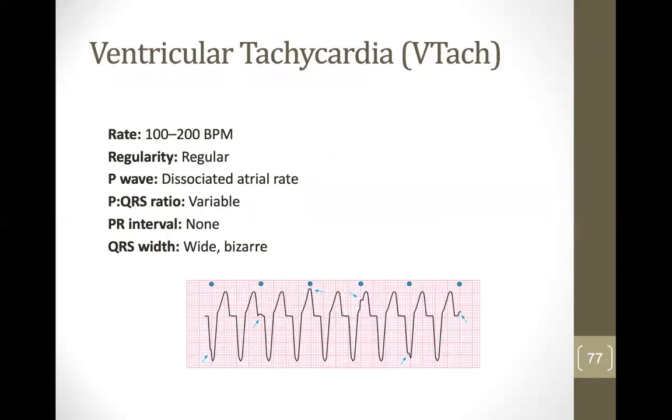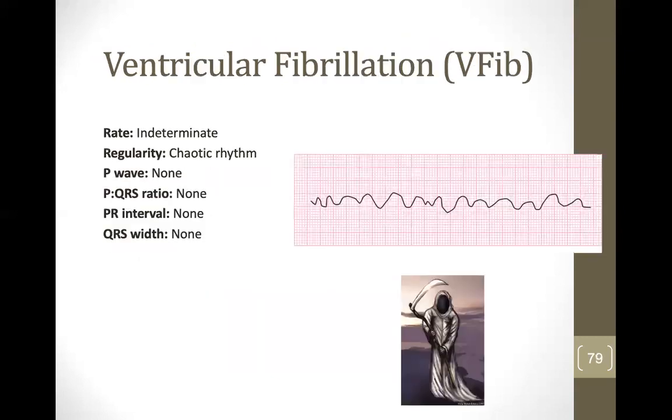So what's interesting, and I just want to do this as a side note, when we go back and we look at ventricular tachycardia, this might be perfusing, meaning it might be pumping blood, therefore bringing oxygen to different places and around in the body. If it's not, and it is pulseless, so it doesn't have a pulse associated with it, they are very quickly going to be going into ventricular fibrillation. Here is where we have quivering of the heart. This is not producing a pulse at all, but we have this chaotic electrical rhythm.